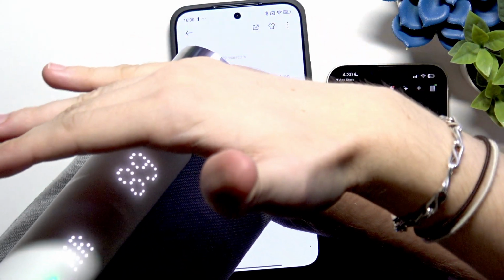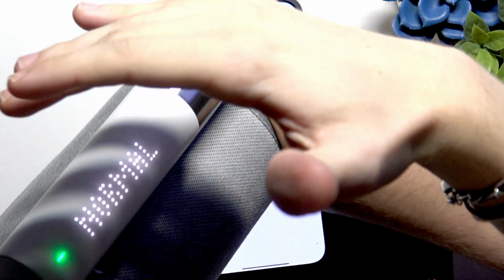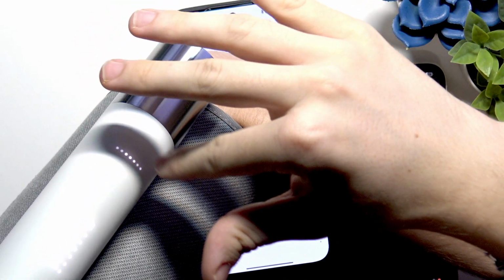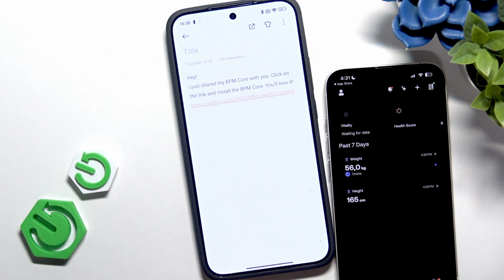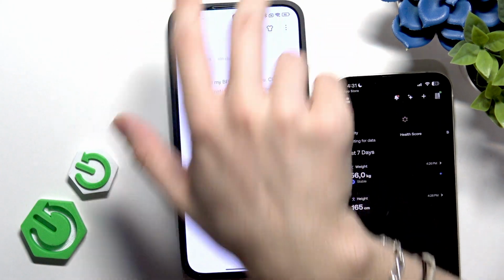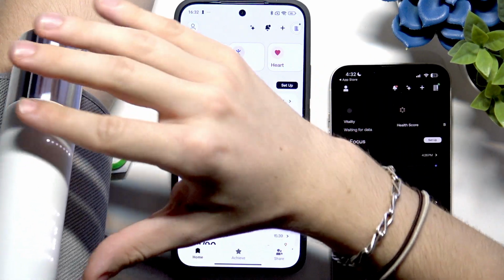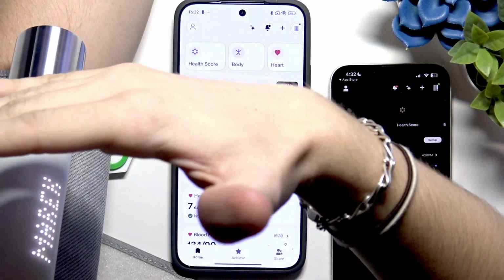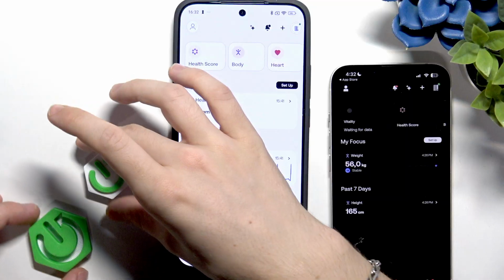Okay, and after doing the tests, you'll see, okay, there's ECG normal, and now I can slide between different users, and there should be me technically. I don't see myself yet, so that's a little bit of a problem. I'm gonna try again, maybe. Okay, now I've tried another time, and let's see if this time it works. Yeah, there's me. So I can click and approve to save it.